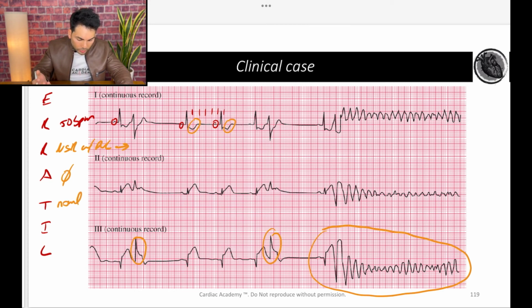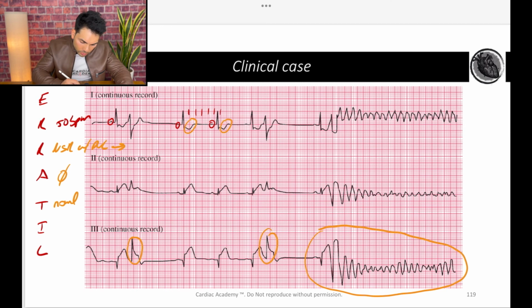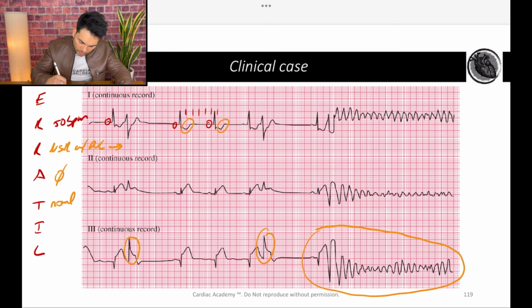We really can't do this in an anatomical region, but let's look at lead 1. In lead 1, we're actually seeing some ST depressions. You see here. Let me just clean this up so we can see, well, they're right here. These are ST depressions. And if we look at lead 2 and 3, you see these are actually ST segment elevations. So we're actually seeing STEMI here, okay?